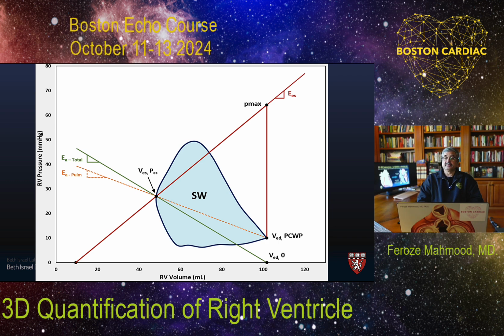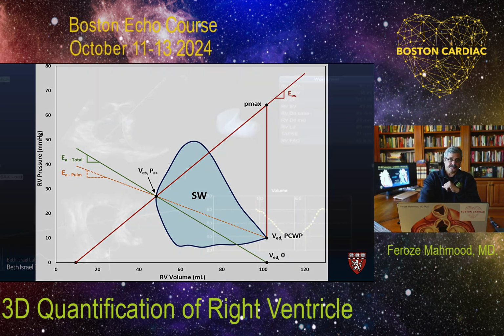That is another way of looking at a very objective analysis of the right ventricle, generating near real-time pressure-volume relationships, and the changes in it can also be tracked with different therapies, valve replacement, repairs, and see how sometimes subtly there are changes in right ventricular function and volume and pressure relationship that are often missed with naked eye observation, or just looking at the gross two-dimensional images and wall motion of the right ventricle.